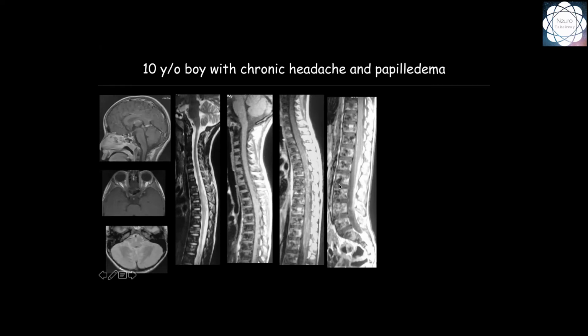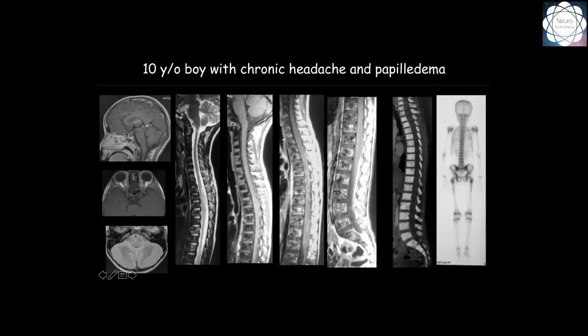We completed the study with CT, and you can see this osteoblastic metastasis of the spine, and you can confirm this with SPECT. Many years later, the pathologist could perform the PCR for H3 K27 mutation, and we could confirm the diagnosis of a diffuse midline glioma, and it was a fatal case.